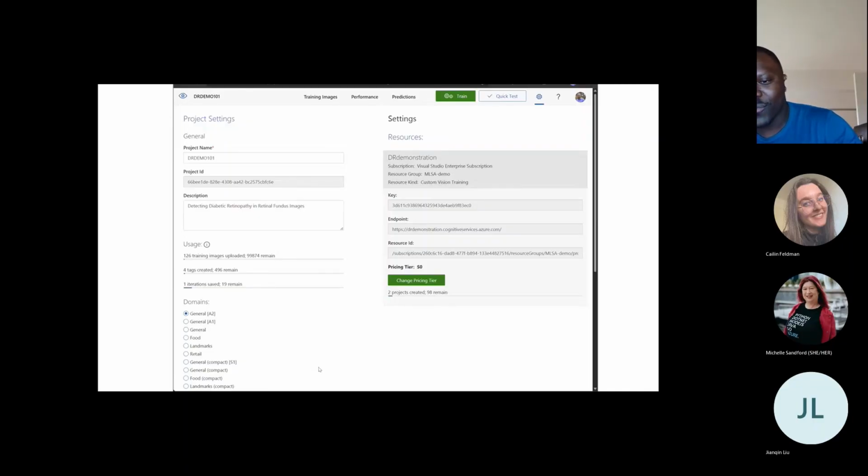You noticed for both evaluations, the precision was good, but the recall wasn't as high. But for the one with the 1,000 images, we're able to get relatively a good prediction, and perhaps you could train it further, but then it comes at the cost of how much you want to optimize at the expense of compute time and cost, and whether it meets the level you want. So perhaps for us, it may actually be sufficient to have it at that level.